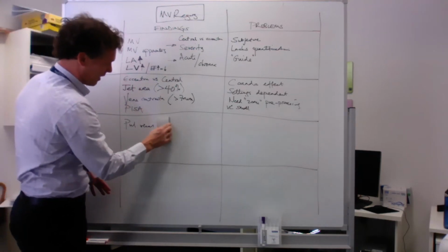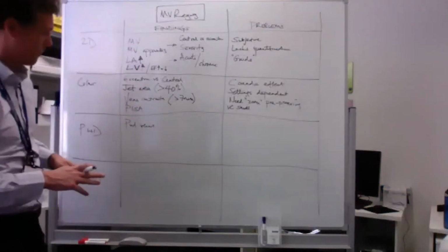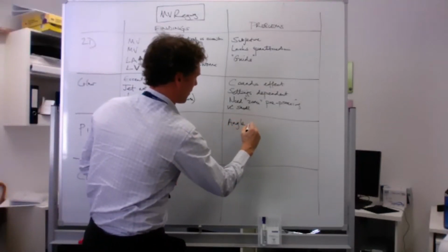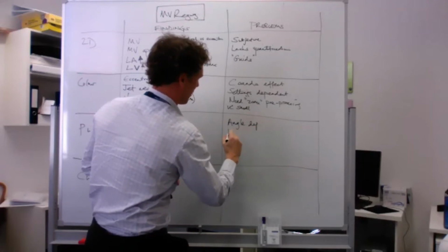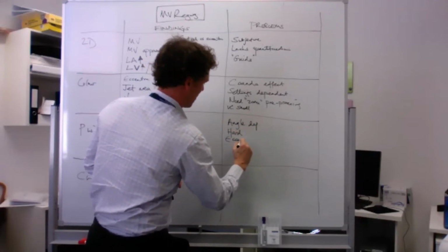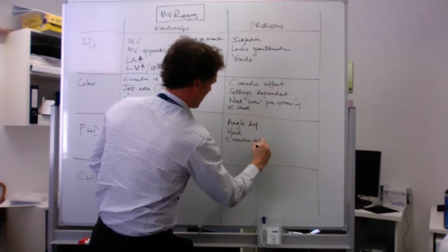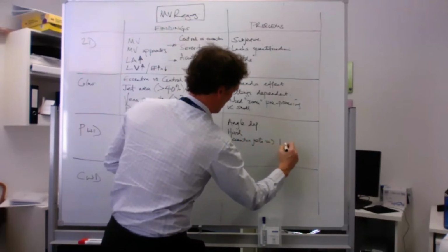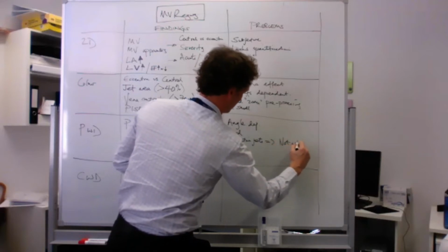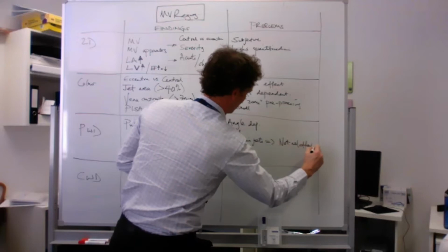What's the problem with it, Ray? Again, it's angle dependent, and if you have an eccentric jet, you might not be able to catch it because it may only be seen in one of the pulmonary veins, and you can't necessarily interrogate all 4 veins. It is also subject to settings, like sampling volume.